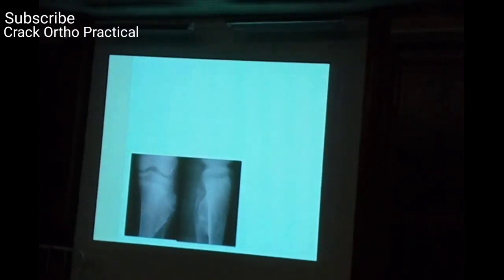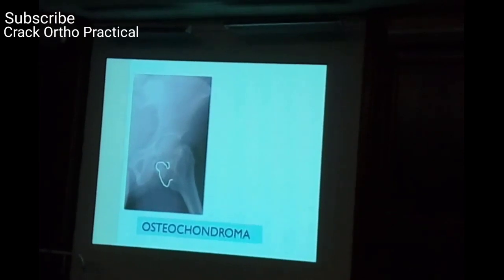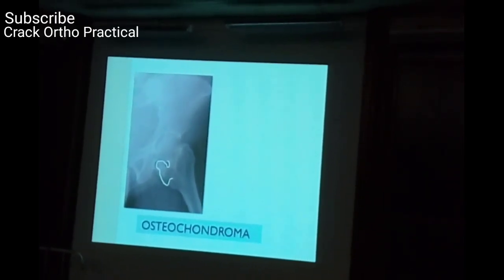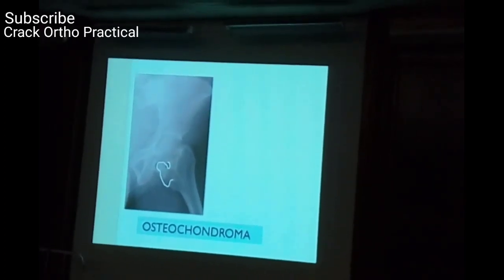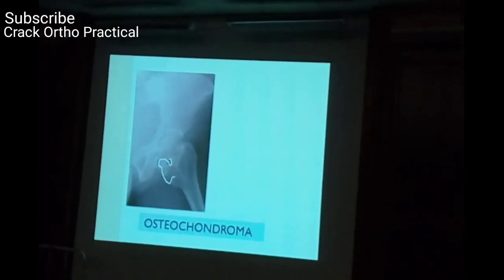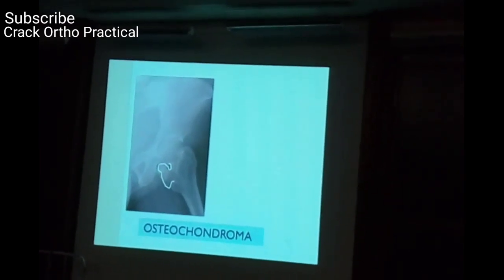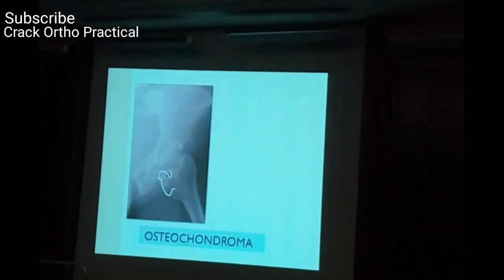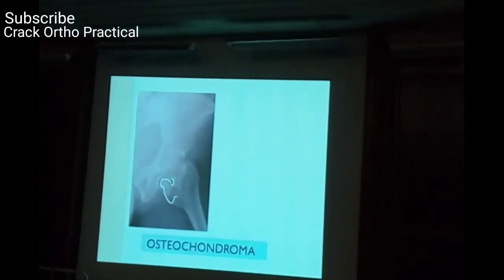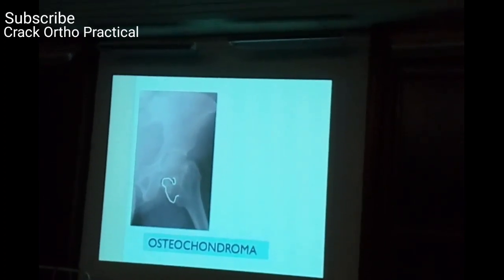Sir, why not heterotopic ossification? No, heterotopic ossification should be along a muscle, or it won't be attached to the bone completely. Something more important than that: medullary continuity is what it should look like. Sessile type of osteochondroma. You can see the matrix is not clear in this. Clear matrix is basically found in a lytic lesion. This is a blastic lesion, so there's a bony overgrowth.